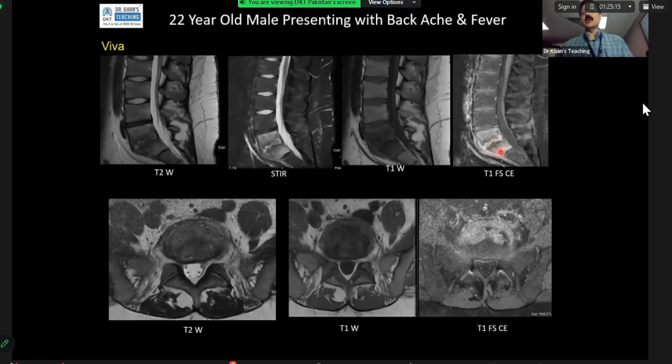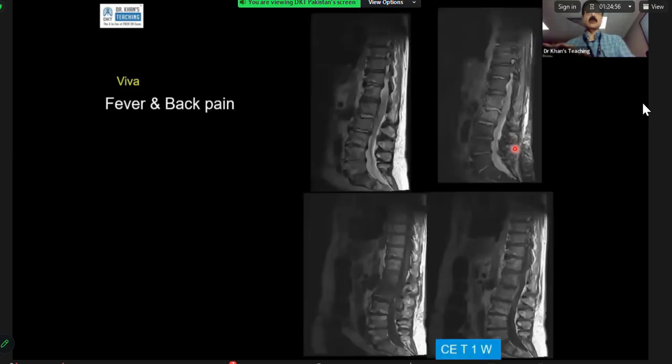And bone marrow edema will also show you enhancement. The candidate did very well, where they ruled out anything happening within the thecal sac. So use the word spondylodiscitis, elaborating that both the disc and the adjacent bone are involved. Well done.